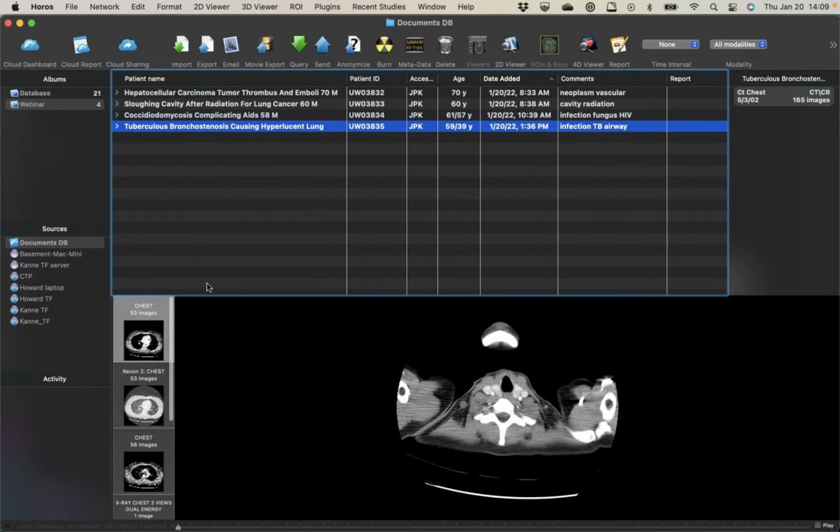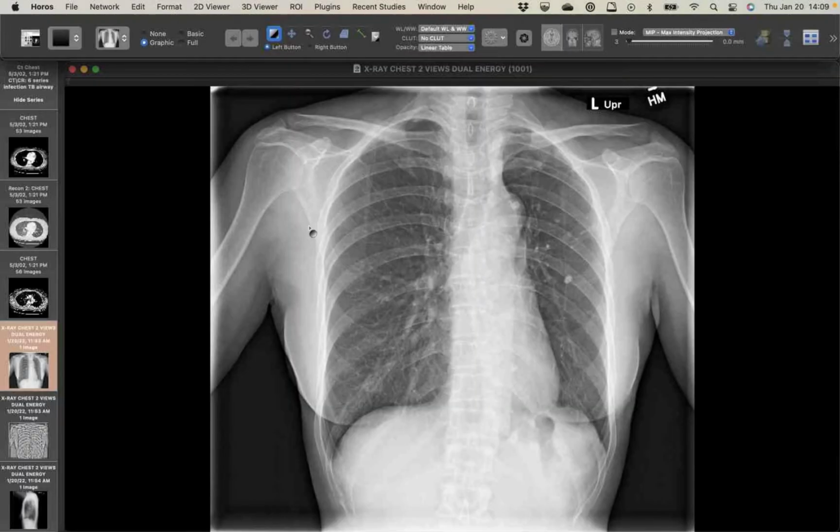Interesting. Yeah. All right, this is a really cool case that I came across. It's a great case for a student or a junior resident. Just starting with the radiograph, you'll notice on first observation there's a striking asymmetry between the left and right lung. The right lung looks pretty normal. The left lung is small, but it's also hyperlucent, and you'll notice there's some calcifications here.